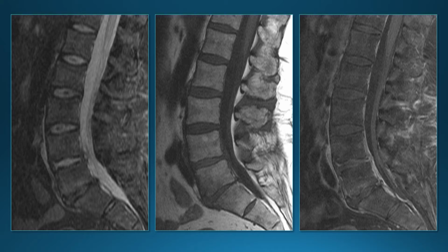One thing we do see is at this L4-5 disc, the disc is maybe slightly bright on the stir image. Also, we don't see this dark area that we see in the center of these other discs. So this dark area is called the intranuclear cleft, and most of the time we'll see that in a normal disc.